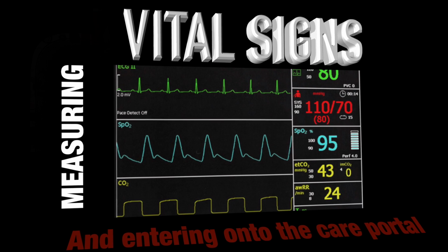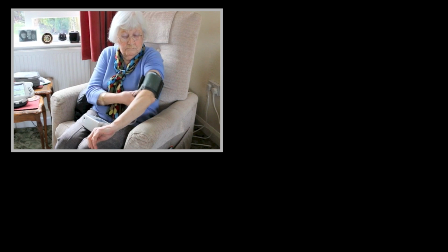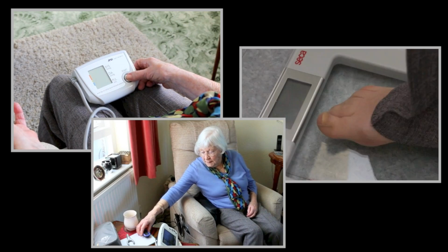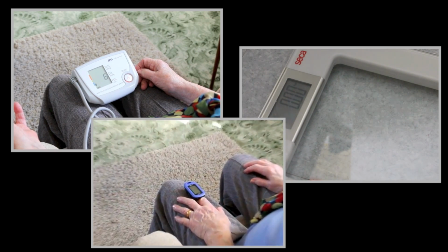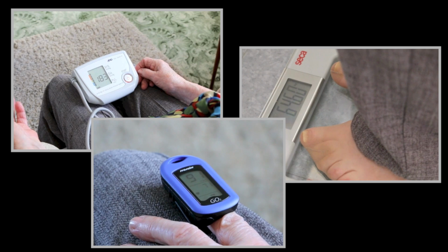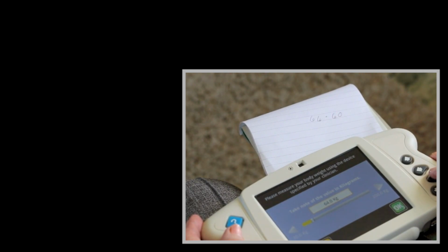Measuring vital signs and entering onto the Care Portal. The patient will be provided with the appropriate peripherals for monitoring their condition. For example, NIBP monitor, oximeter, weighing scales. We also offer a variety of peripheral connectivity: Bluetooth, hardwired, manual entry. Entering manually, the patient can use the touchscreen sliding scale or the physical buttons.